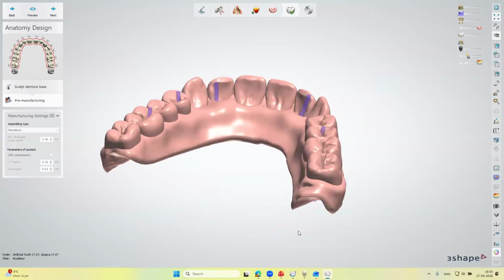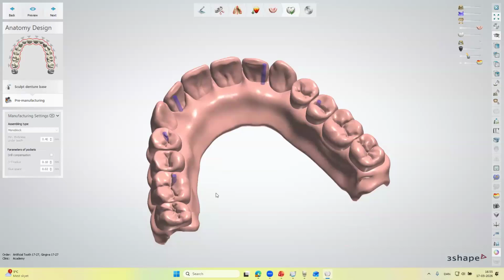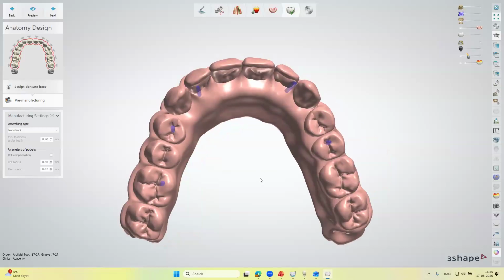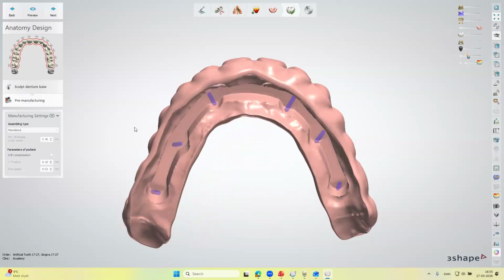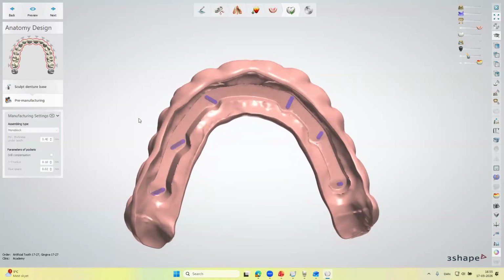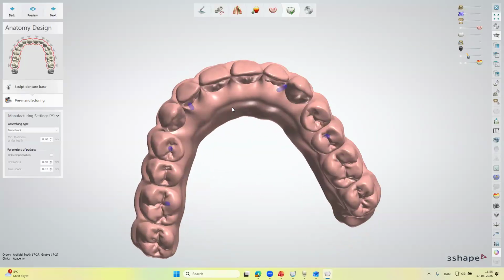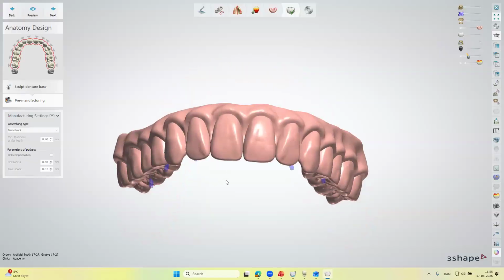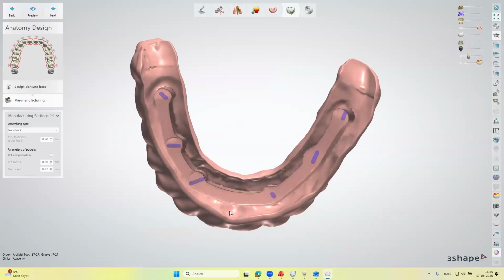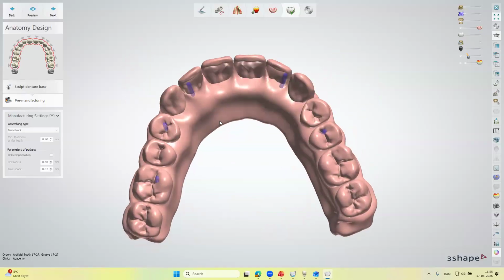So we could just import it as the other object and just use those screw holes afterwards. But again, I'm a bit skeptical when it comes to milling the secondary object like this, as those screw holes are very narrow, and as far as CAM software will not be too happy to allow drills going through such a narrow holes.